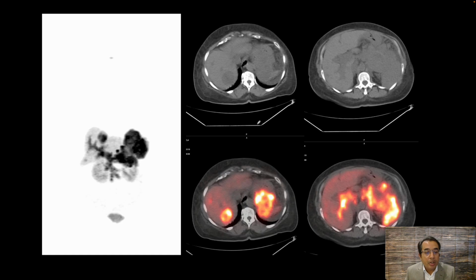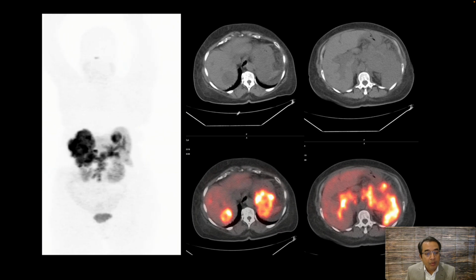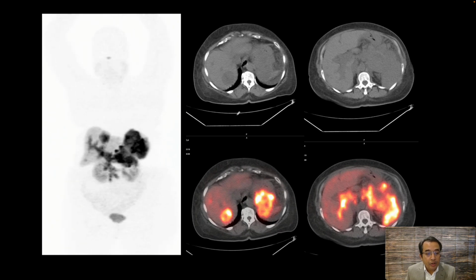Our second patient has a history of a neuroendocrine tumor arising from the tail of the pancreas and invading the spleen. We performed a gallium dotatate PET-CT for whole body staging. We see on the rotating image that they have this large mass in the left side of the abdomen with intense uptake. They also have a focus in the liver consistent with metastatic disease. So this is their primary, invading the spleen. This is a liver metastasis.